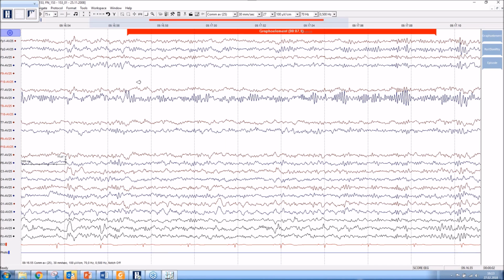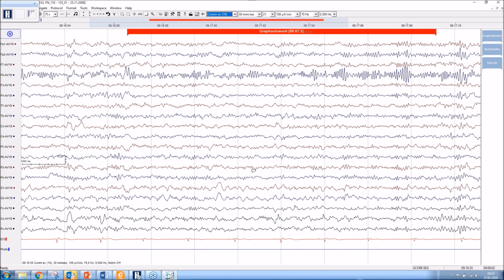Another thing is how to select the montages. You can see here that some of these channels are not used. This was recorded with 19 sensors, and we can choose the montages here. So now I choose a common average 19 sensors, and you will see it more correctly here.